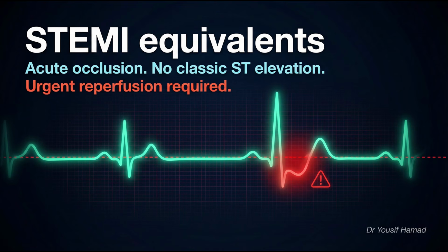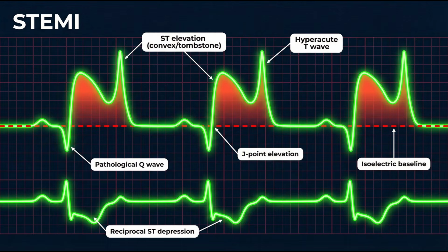STEMI equivalents are electrocardiographic patterns that indicate acute coronary artery occlusion despite the absence of classic ST elevation. Recognizing these patterns is critical because they require urgent reperfusion therapy similar to classical ST elevation myocardial infarction.